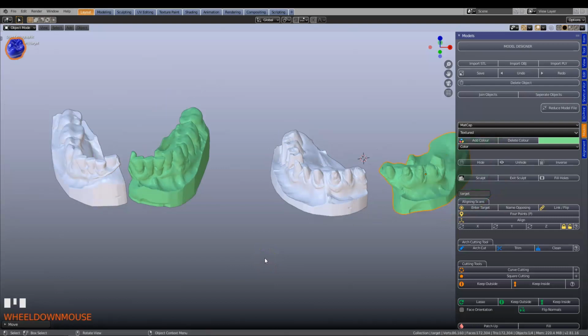In this video I'm going to be stitching together 4 quadrant models into 2 solid models. So we're using Blender 2.81 and the alignment add-on Blender for Dental.